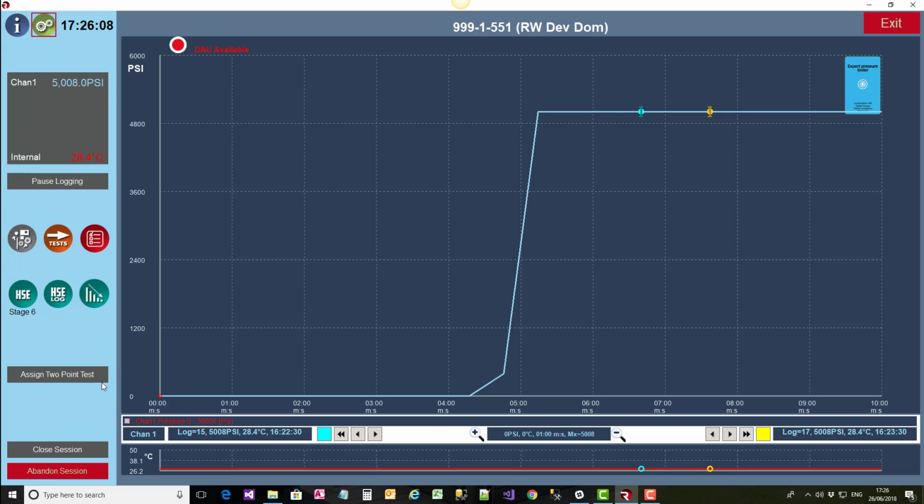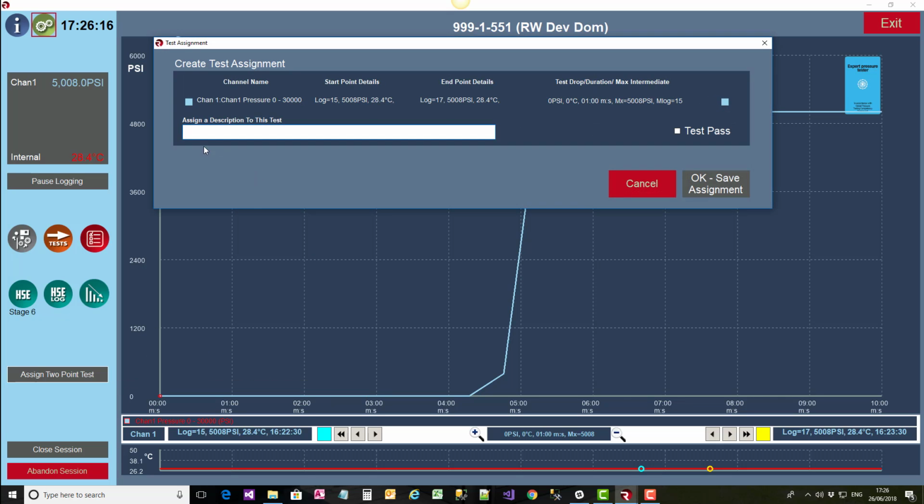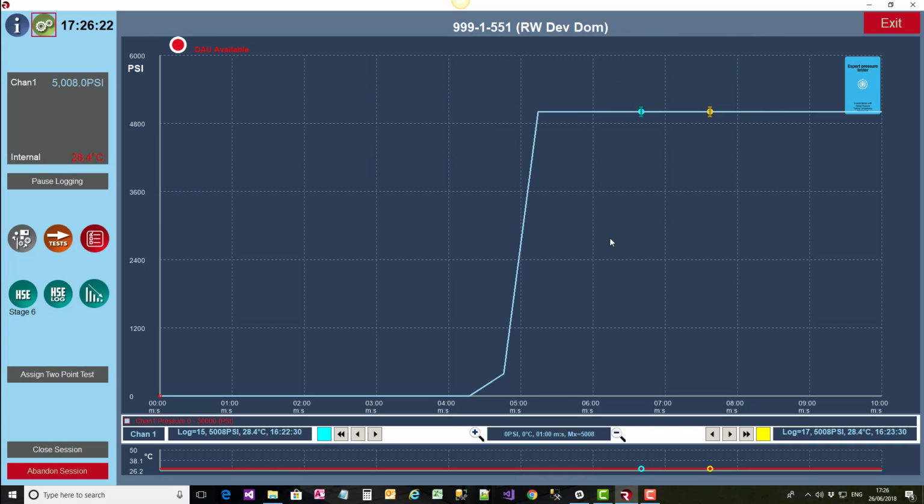Now, once you've saved that assignment, there is no current test. So if we go back into this form again, there is no current test section to be able to view those TDS parameters. If you missed viewing the TDS parameters to write them down on your sheet, one way to do it is, I mean, you actually have all the information here, in the left clicker box, in the right clicker box, in the middle clicker box. Everything that you need for filling in your data sheet is there.